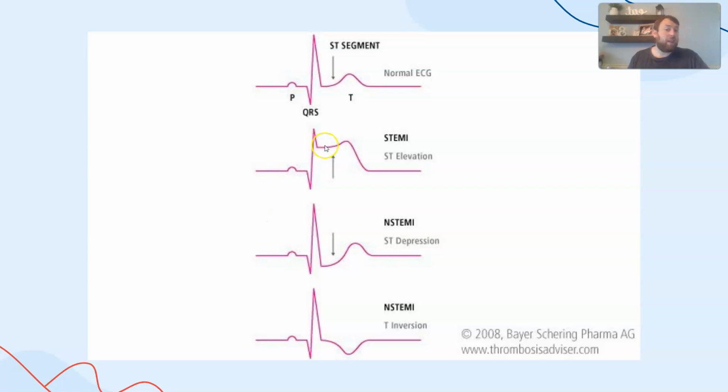And so we have this event here that pops up over and over and over again because these ventricles aren't getting back to their normal position as quickly, and therefore that is an indication that there was a blockage of some kind in the coronary arteries that leads them to not be able to get back to normal.